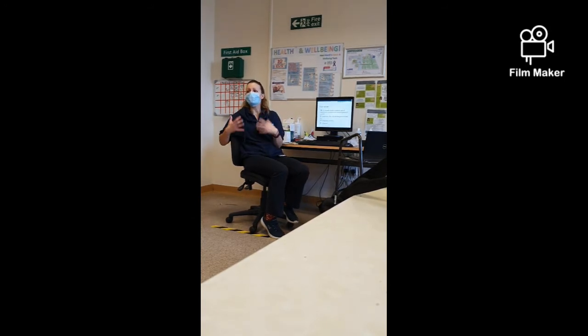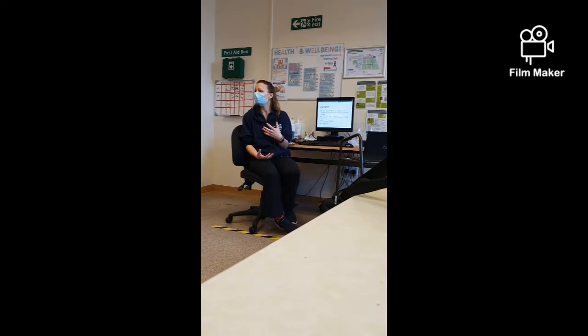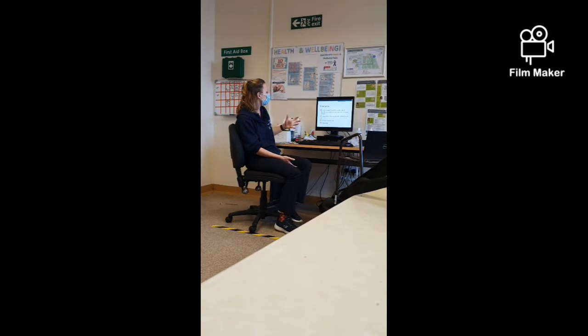Inspiration, we can look at how well the patient breathed in. So if a patient's walking in as an outpatient to have a chest X-ray done as a routine thing, they will be stood and they can follow instructions and take really deep breaths. If you've got a patient that's deteriorated on the ward and they're really struggling with the breathing, they are going to struggle to take deep breaths, okay? But what we do have to look at is, have they taken a good deep breath when they've had that chest X-ray taken?